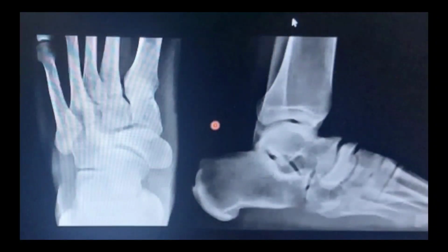Here are two radiographs in AP projection and lateral projection, clearly showing that the navicular bone is sclerotic because of the lack of blood supply, and this is avascular necrosis, which can be seen on both the lateral and AP projections. If you see this in a close view, again this is the navicular bone, a very thin bone. On the top image you can see this is a wafer like navicular bone because of avascular necrosis. In the lower image again you can see a very thin navicular bone, and this is what Kohler disease is, and it can be easily picked on simple radiographs.